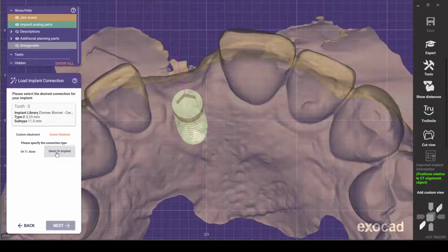If we're making a custom healing abutment, so we're essentially making the same emergence profile as a standard temporary or standard provisional, but we're just sort of lopping off the crown, and we're making a custom healing abutment. At that point, I feel very comfortable going direct to the implant surface with either printed resin or milled PMMA. And I have not seen that fail or unscrew any more often than a normal healing abutment might loosen and unscrew.